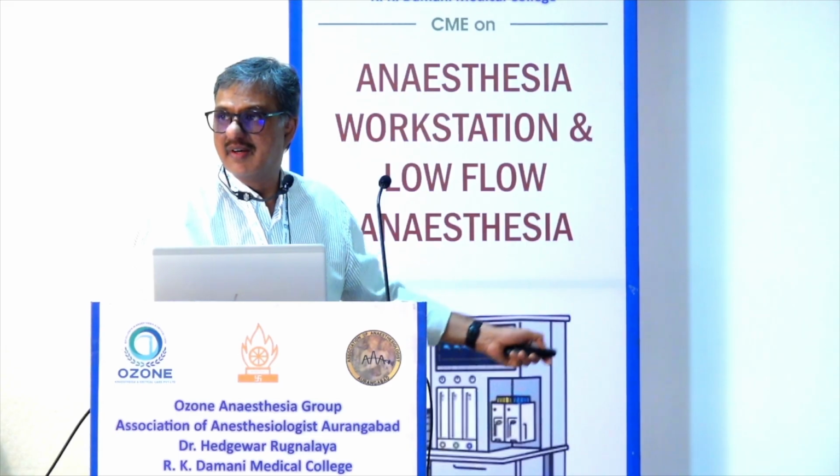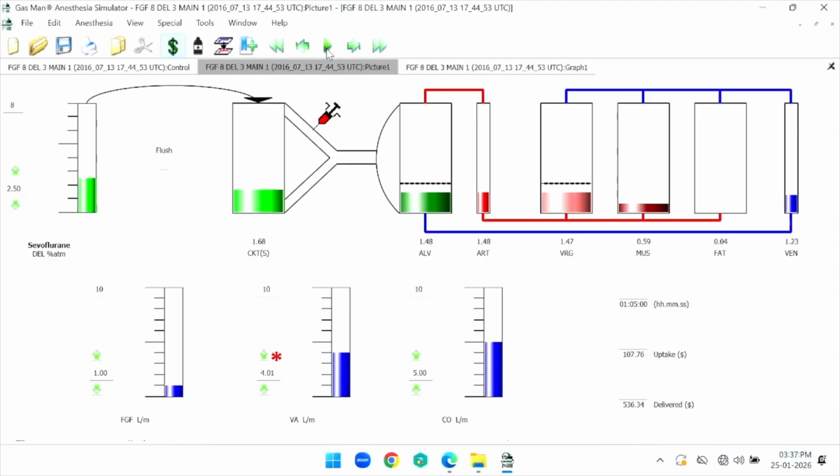It is remaining at 1.47. Steady state of anesthesia. 1 hour. Should I make a fast forward? We can fast forward also. Yeah, we can. So 1 hour 30 minutes. Cost is, VRG group 1.5. Now 2 hours, 1.59. Fine. 2.5 hours, 1.65. So steady state of anesthesia is there. And 3 hours, 1.7. And look at the cost. Total cost is 944 with 1 liter.